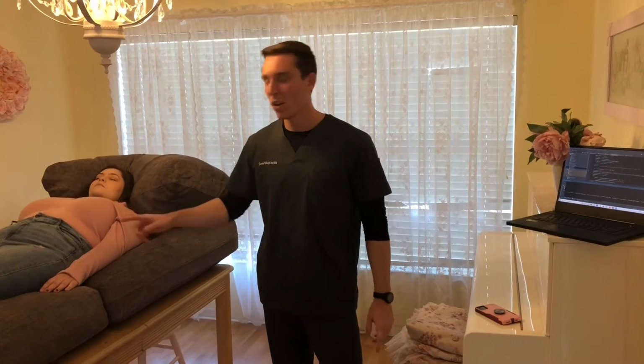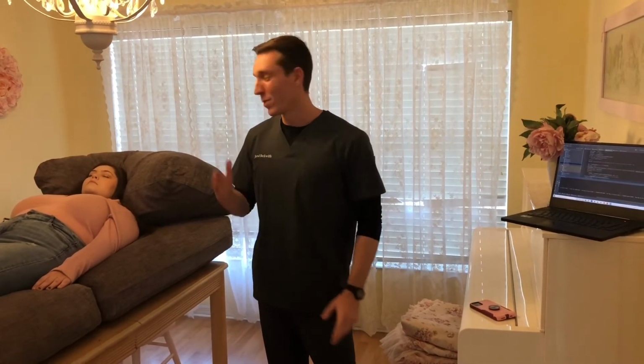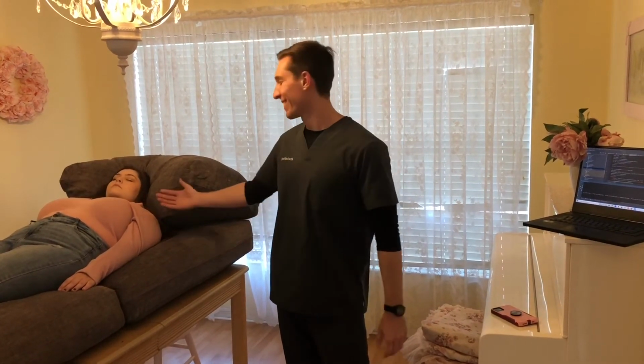And this is our software to solve that specific problem for an EEG technologist, to make sure activation procedures stimulating all the 4 patient limbs is done twice a day. It's supposed to be done every 12 hours, and it almost never is. And I think, in my opinion, it's because it's too difficult. And this makes it easy, and all the activation procedures will be done, so the reading neurologist will have the best EEG record possible.